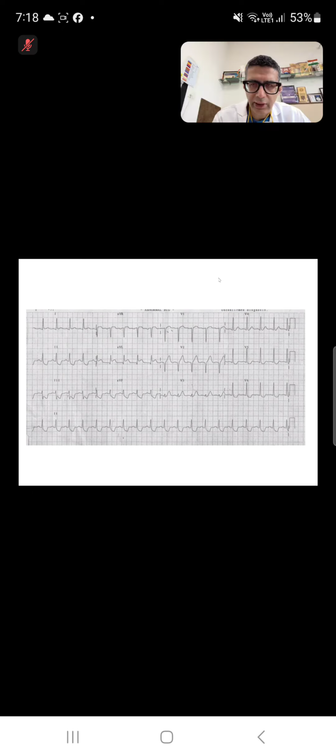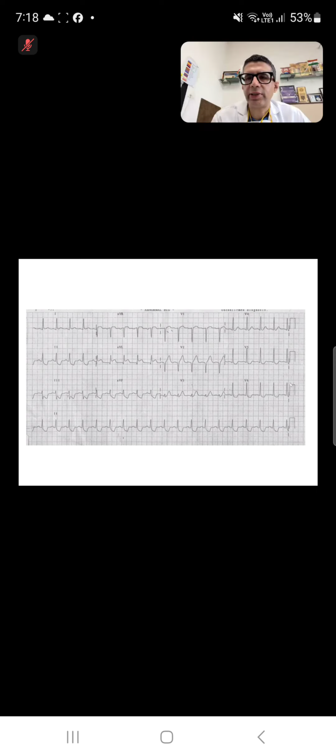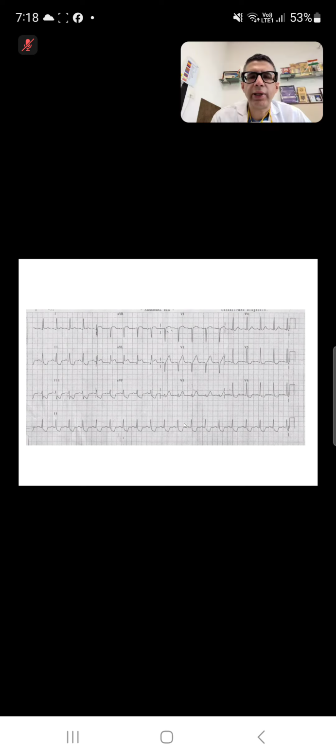Sir, good morning. Morning, Prasad. Sir, I cannot identify P wave. No, so go in order. Standardization, sir. Yeah, you say normal standardization. Normally standardized. Yes. Tachycardia is there. You have to tell the heart rate.